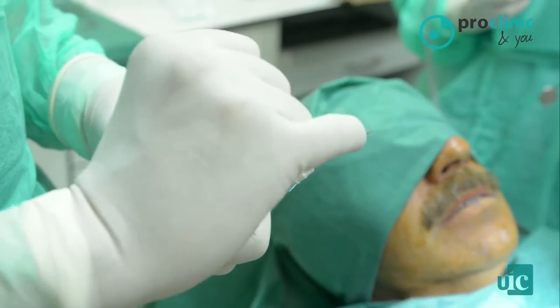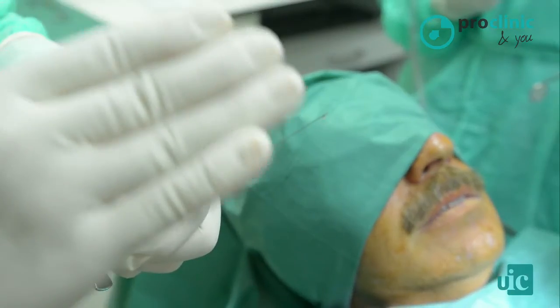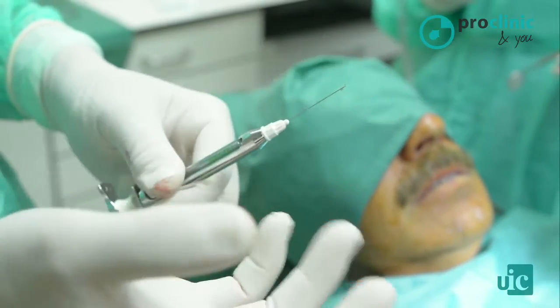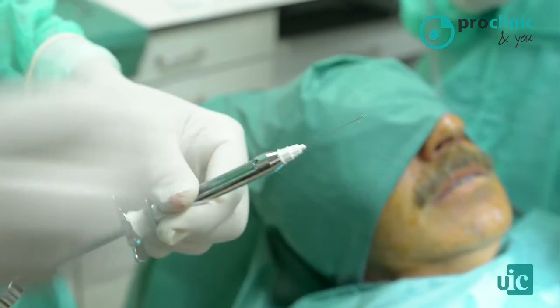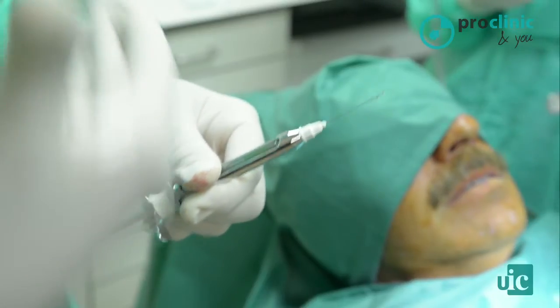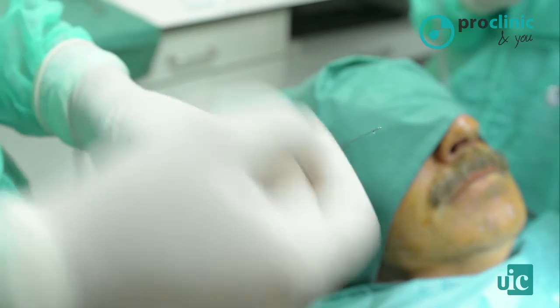The bevel is very sharp-pointed, and when it reaches the bone, it usually blunts. Because of this, we should remember that to perform several punctures with the same needle can produce micro-tears in the soft tissue, and the patient can feel pain due to this.